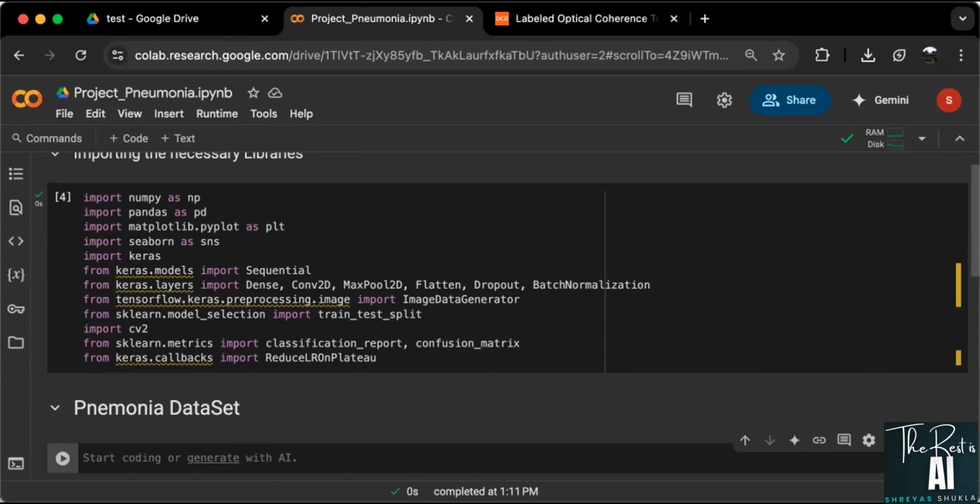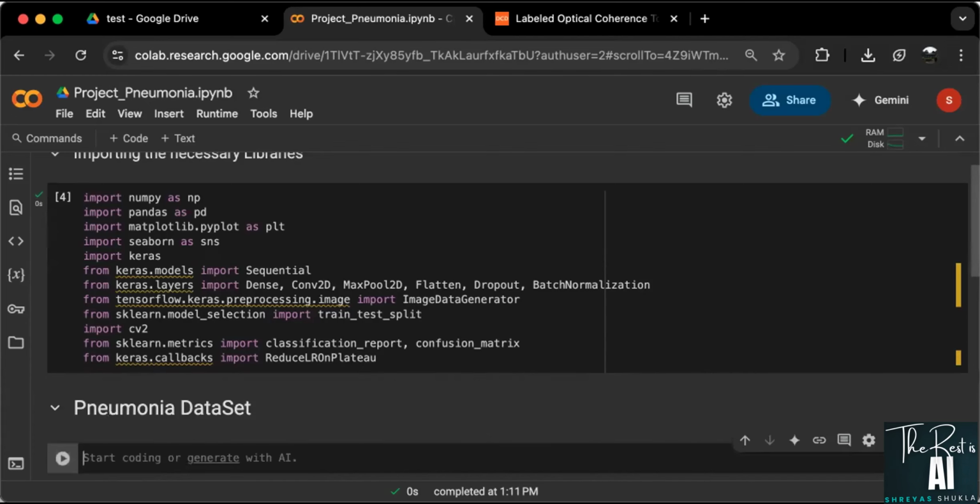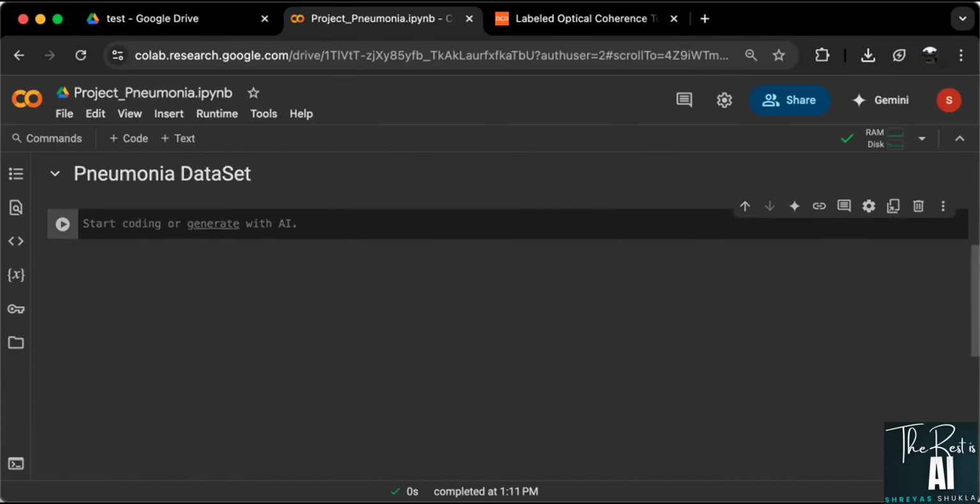Let us see how you do that, and let me just fix the spelling here. This is NEU. So I'll be starting with defining two labels. I'll say that I have labels which are pneumonia, and I also have normal. So these are the two labels that I've created in a list.